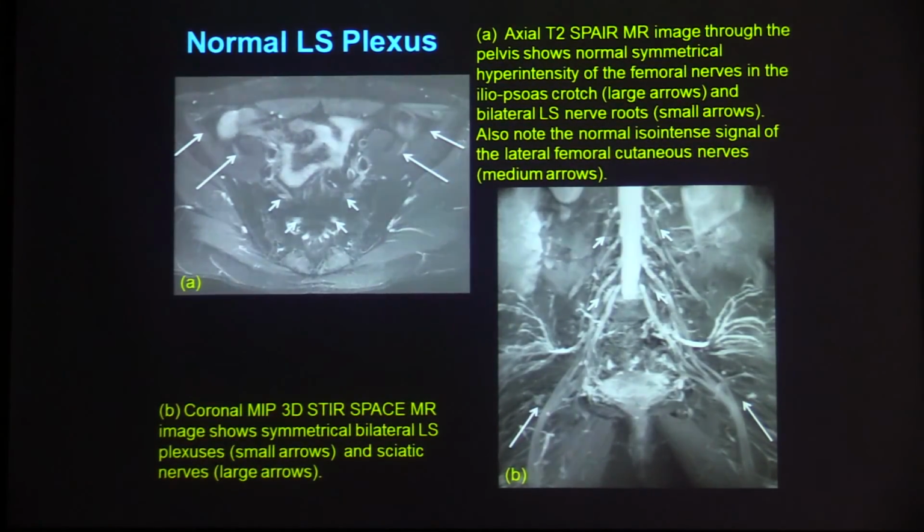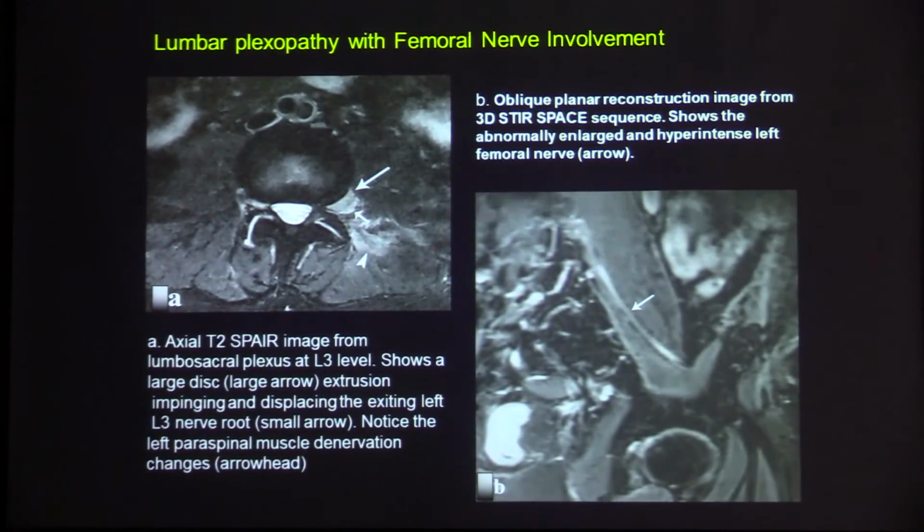I'll just finish up with the potential work that we did before I was at Hospital for Special Surgery. I worked at Johns Hopkins where we did a lot of MR neurography, and we're doing a lot of that now. We're using some heavily fluid-sensitive sequences to really improve the depiction of nerves, as you see with all the arrows. Unfortunately, the vessels are still also bright, so you get slow flow in the veins. That can be confusing, so we're looking at vascular suppression sequences to help with that. But in people who have this type of pain, it may be useful as an add-on sequence. Typically we do our STIRs as a sagittal image, but doing a 3D STIR type sequence may be useful as kind of a neurography add-on.